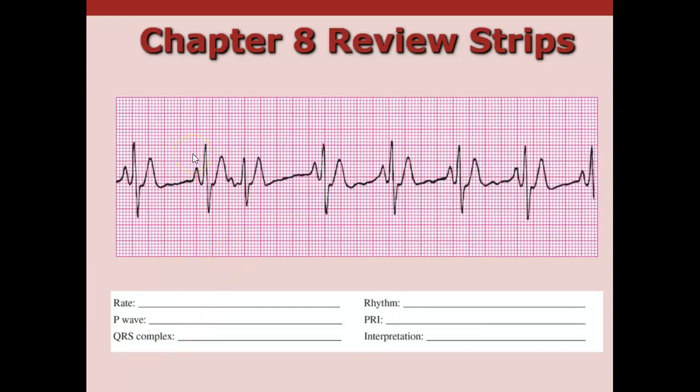So we are looking at, hang on, let me see where I'm at in my book so I can look at this. Okay. 1, 2, 3, 4, 5, 6, 7. Looks like 8. We could probably call that 8. I'm trying to find, I'm sorry, hang on. Anyway, okay, here we go.